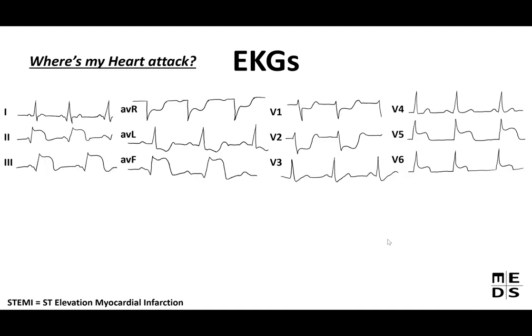So here's an example. If you were to have an EKG strip, I know this is not a real one, I actually had to draw it because trying to find a good one to illustrate this without copyright was a huge pain in the ass. Actually, I think the amount of time it took me to draw this was a bigger pain in the ass. So what you want to do is look for these quote-unquote ST elevations, tombstones.